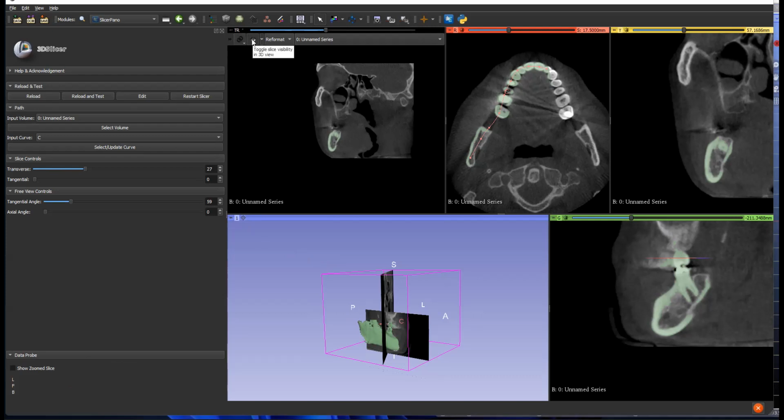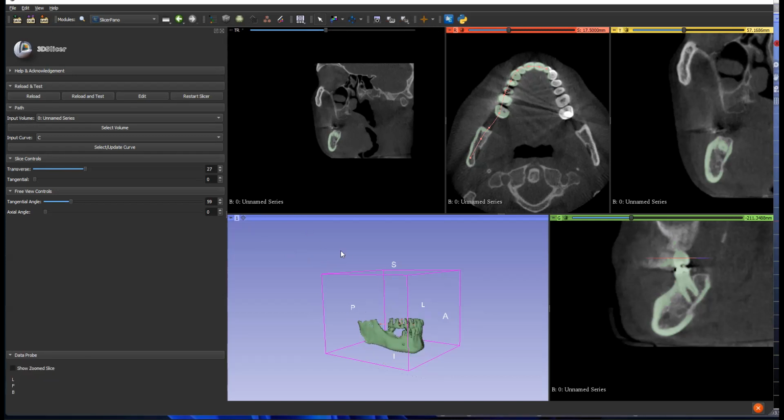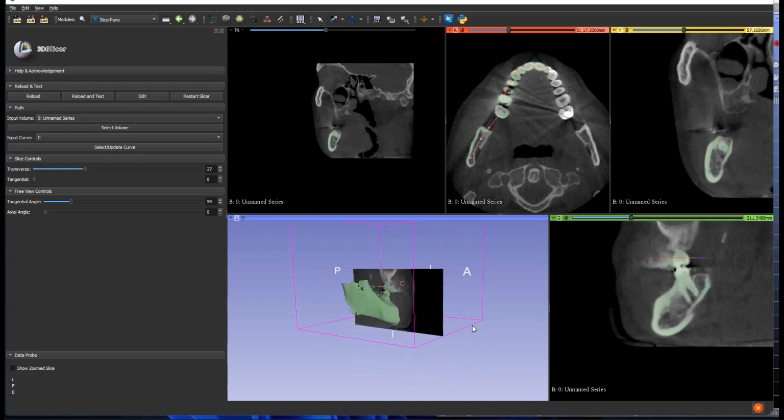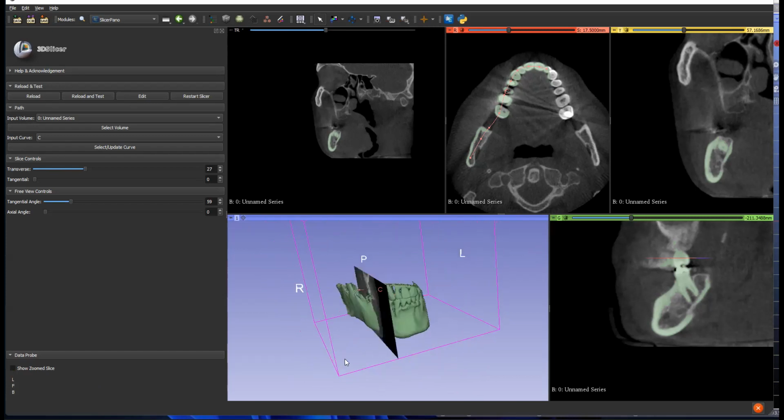So as soon as you close the eye, all of the slices disappear. So if you wanted to open one slice, unlink it, because this links all the slices, and open up the eye. That means that we've only got one slice that we need to worry about. For me, it's easier, but for you guys, I don't know, it depends on how you work.